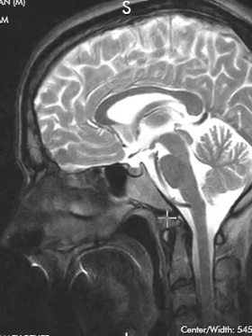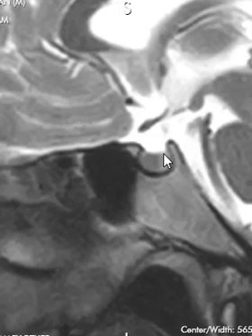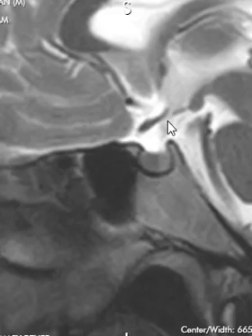Now right in the central part of the brain at the midline, we see a little round ball here. This is the pituitary gland. We look carefully at that to make sure the pituitary gland is nice and normal in size, and it sits in a little cup here called the sella. And the sella is normal in size, not expanded, and again the pituitary tissues look normal. And we can see a pituitary stalk that comes down into the pituitary gland.